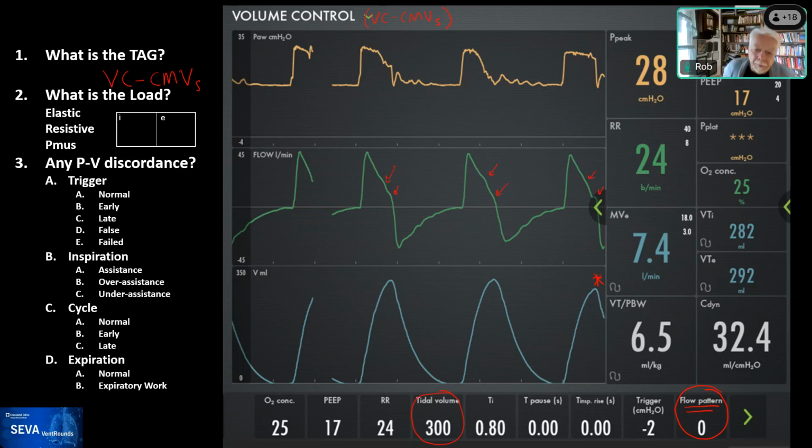Absolutely. So we had a meeting with the engineers, and the engineers explained to us that no, actually the flow was being controlled perfectly. And if you turned up what they called tube circuit compensation, you could see the real waveform, but that this was because there was evidence of other things going on, that this was how it would look if a sensor was in the Y of the ventilator.